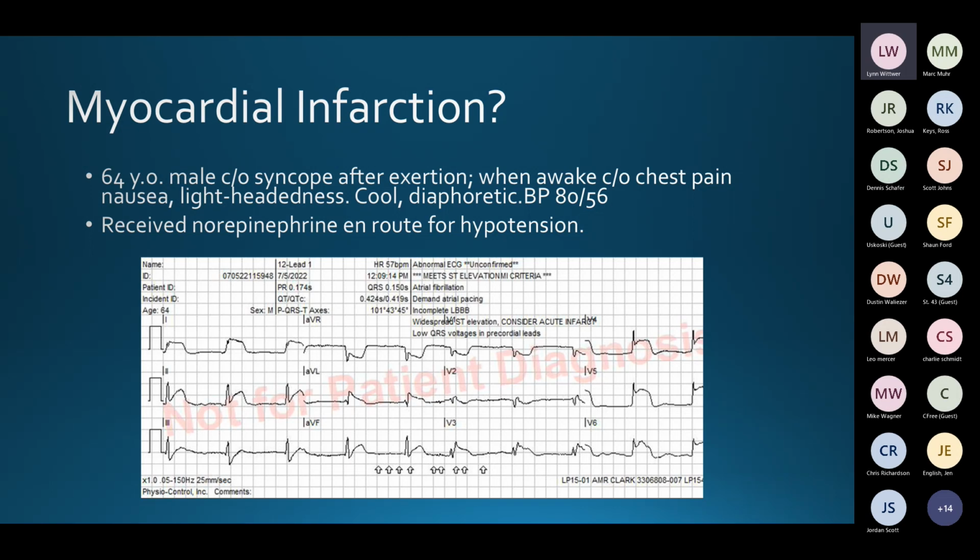You have an upright QRS and an upright ST segment. Here you have an upright QRS in lead 2 and aVL. This guy had a very massive coronary occlusion, and he got fixed. He left the hospital some 3 days later with his stents in good condition.